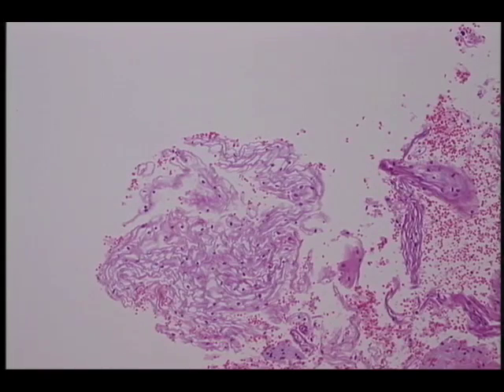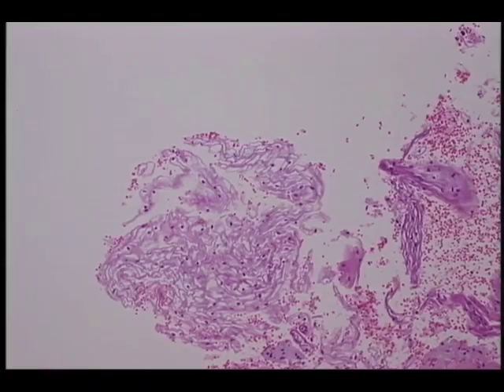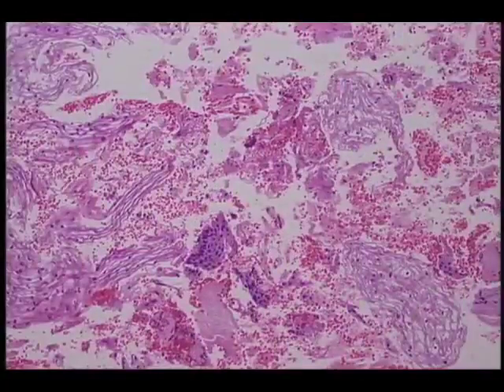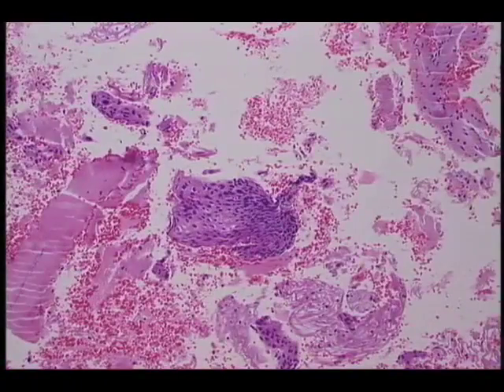And again, the presence of this superficial normal squamous epithelium just indicates normal areas of the cervix. Even though you don't go down to basement membrane, the presence of normal surface is quite diagnostic of normal. So having this would be diagnostic of normal. As we scan, however, we can see these small pieces of squamous epithelium that are somewhat darker. And in this particular level, these pieces may not be entirely diagnostic.